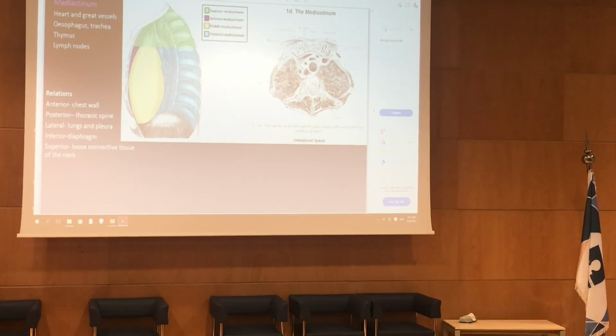So this is a sagittal section, or like a lateral view of the thorax, right? So you have the ribs here are anterior, and the thoracic vertebra is posterior, right? You have the diaphragm, and this is mainly what makes the mediastinum. So the mediastinum we divided into superior mediastinum, which mainly contains the top of the major vessels, and the upper thoracic vertebra.